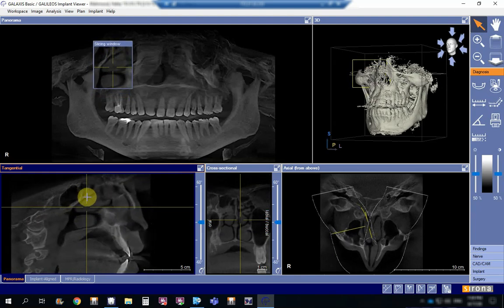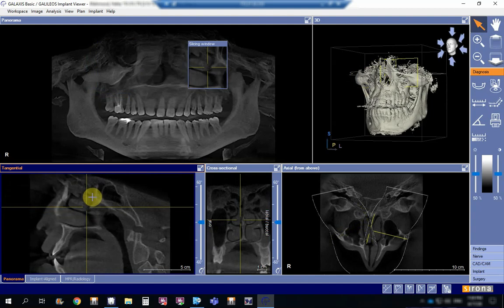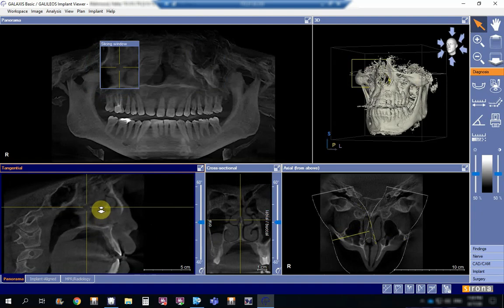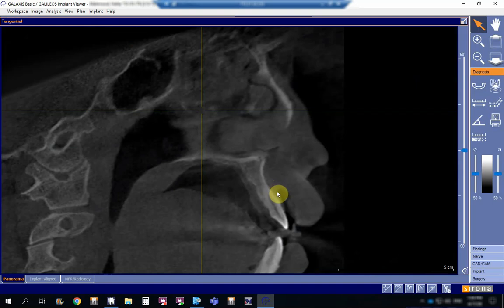And if I go even more in the middle, this is the maximum coverage. You see that when I move, it stops. It doesn't go inward anymore. Just to get oriented, this is the palatal shelf over here. This is the soft palate. Okay, and we are actually inside the nasal cavity. This is the sphenoidal sinus over here, and these are the atlas vertebra C1, C2, and C3.